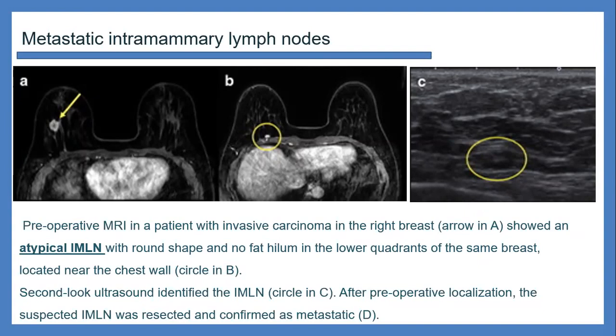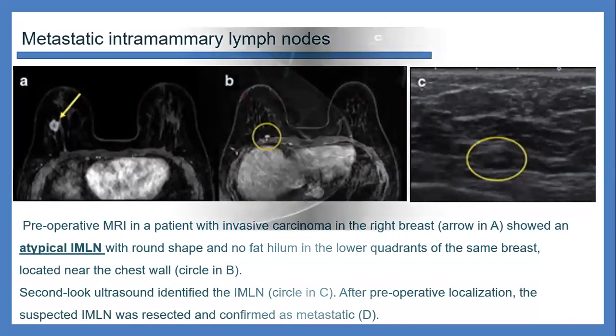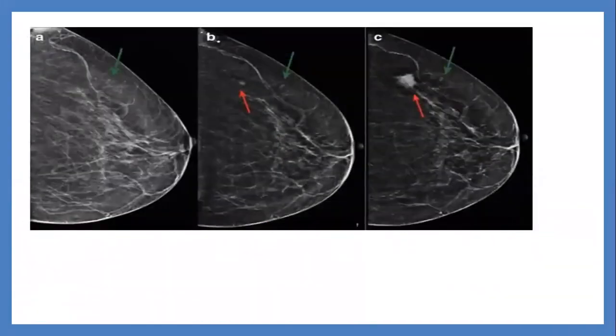It is an atypical intramammary lymph node and biopsy proven to be metastatic. They confirmed after biopsy to be metastatic lymph nodes. As you described before, more toward rounded, and the fatty hilum is gone, slit-like only. It is indistinct, and it was metastatic.